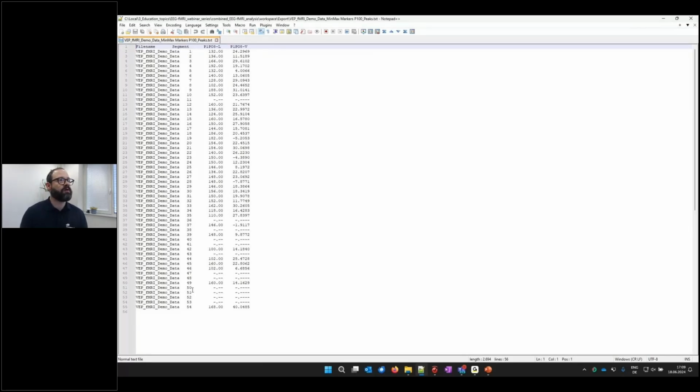And then you have two columns here because we extracted both the latency and the amplitude. The latency is marked by L and the amplitude is marked by V for voltage. And you can also see here, this is for the P1, shortened for P100 marker, and the PO8 electrode. And now you get those values for each of these trials.